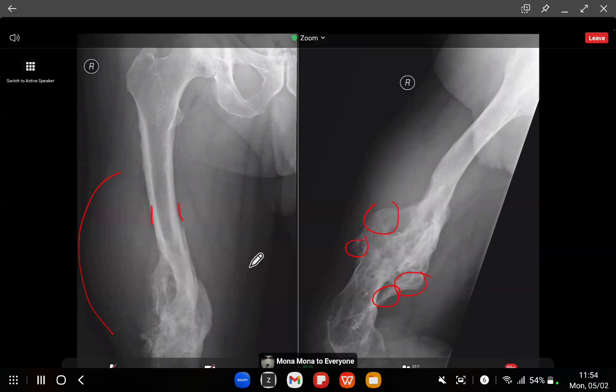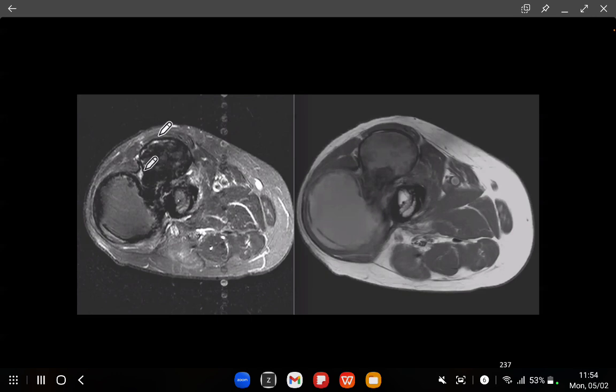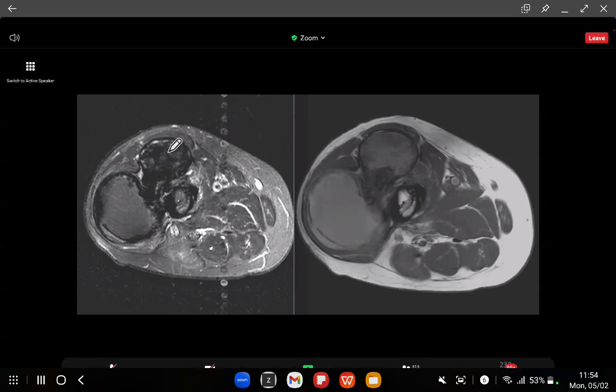Now, everyone, remember this. If you get this in the exam, think about it. Male patient, lots of soft tissue swelling, lots of new bone which is spiky, and you may get a pathological fracture through the bone, and you've got a lot of hemosiderin around. It's hemophilia, hemophiliac pseudotumor.